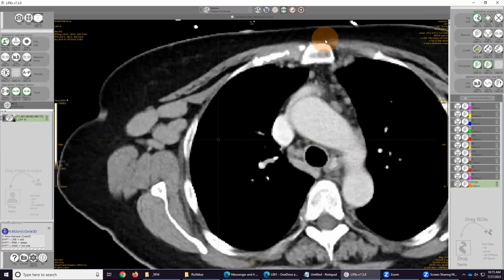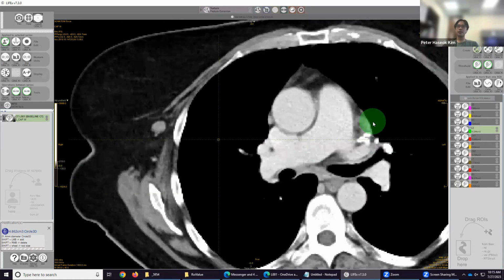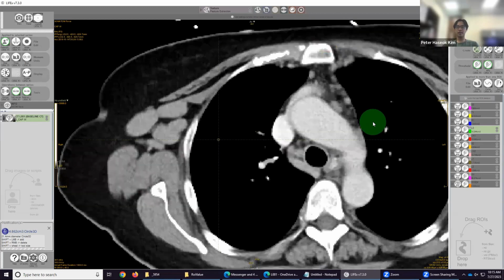What about the normal lung and spleen? I'm trying to think if he's going to continue with the harmonization model, but we can do that. So for normal lung and spleen, all you're basically doing is segmenting 3 different ranges of tissue.